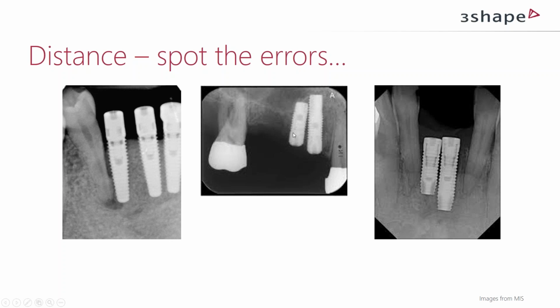In the middle picture we can see that they tried to squeeze in 2 implants. A bit afraid of the canine over here, they wanted to go away far, not to hit the tooth, but by doing so actually did not give enough room for the second implant. So again, with planning we would have seen this, and the guide would have helped us to place the implant at a perfect distance to the canine. Instead now we are crowded into this small area.